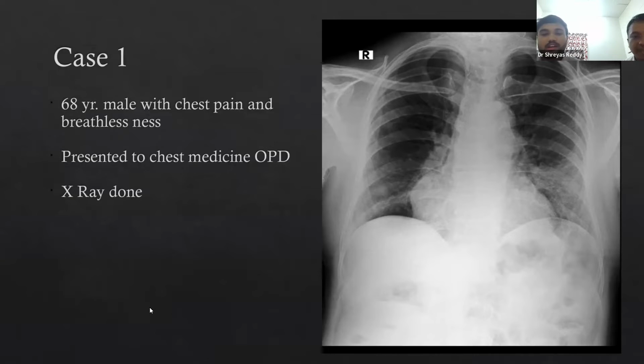Because this can come as an exam question for you. First, I would think of a lung neoplasm. That is the most common thing that comes in the area. Right heart chamber dilatation needs to be kept in mind, and the pericardial cyst is what is to be kept in mind. And of course, a lung neoplasm is possible.